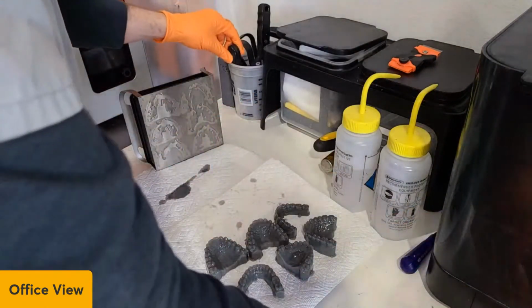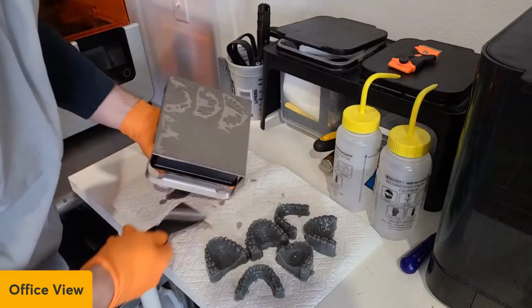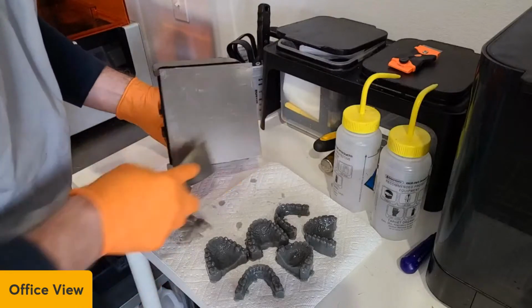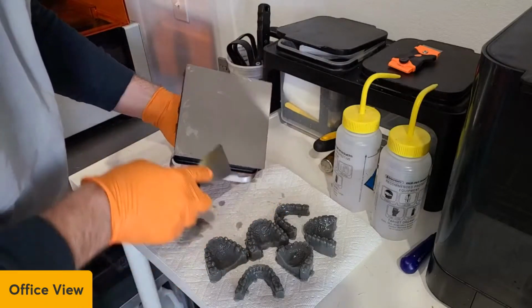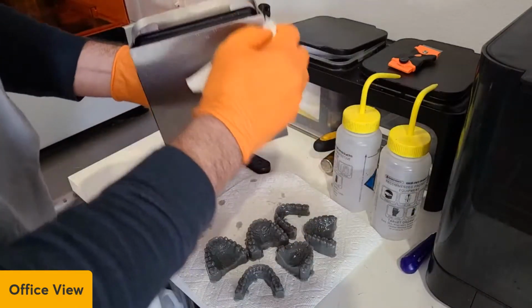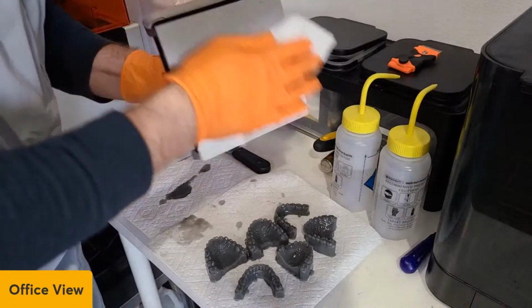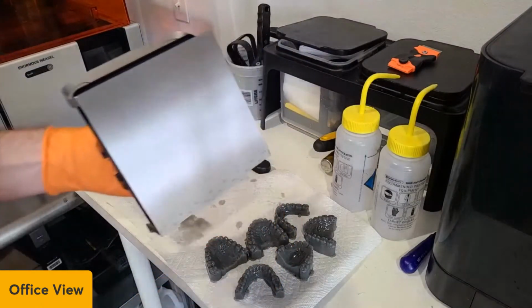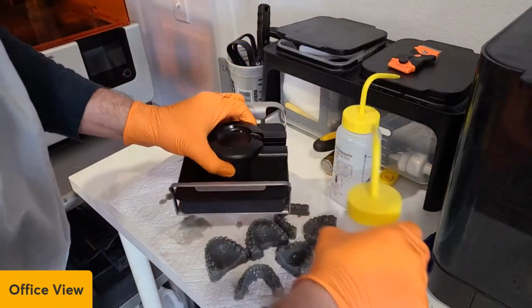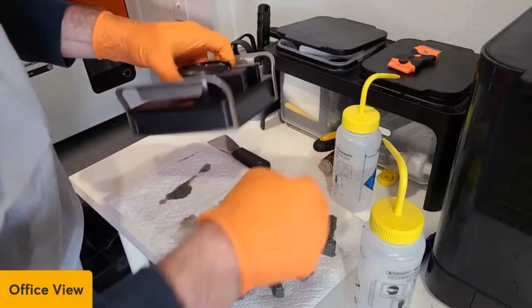So I am going to clean this up. All right, so nice and clean. I can wipe this down. I'm over here. Yeah, I'm live streaming. That's my wife. So nice and clean. The one thing I urge everybody to do is you can wipe this down. And that helps keep the sticky off of here because it gets all over your gloves and stuff.